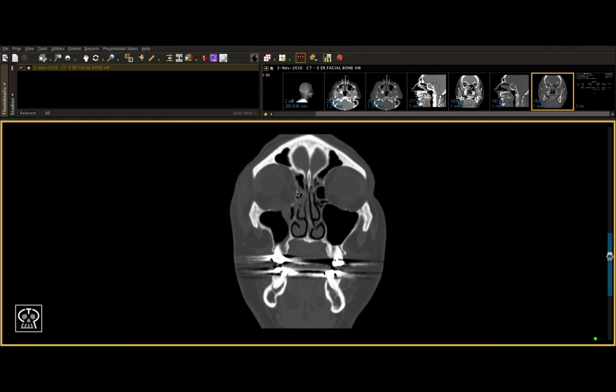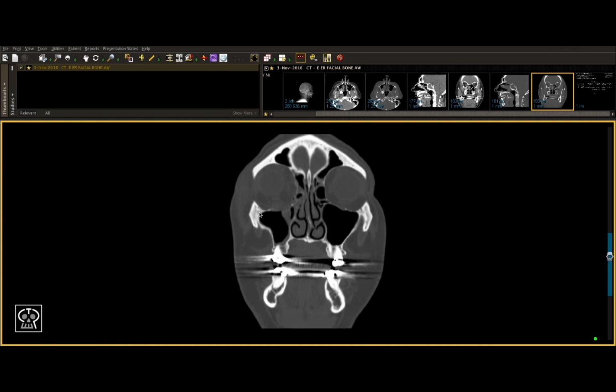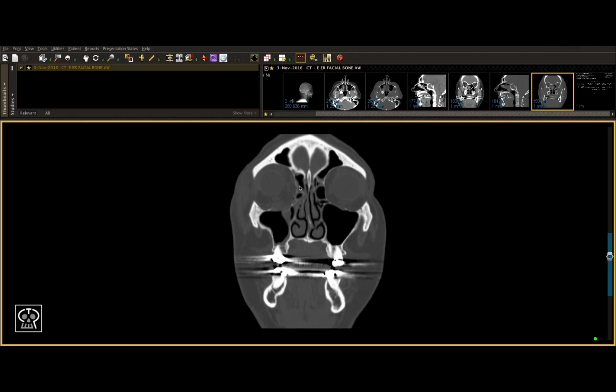to fracture. When you often hear people talk about blowout fractures, they are simply mentioning the fact that the walls of the orbit are blown outwards or away from the orbit after a force is subjected to them. And this is what we see. We see a blowout fracture of the orbital floor and of the medial wall.